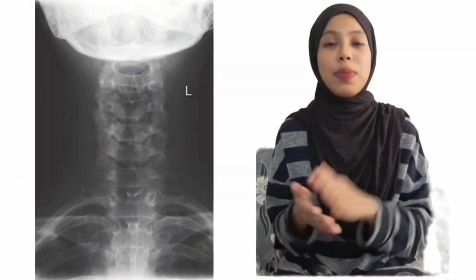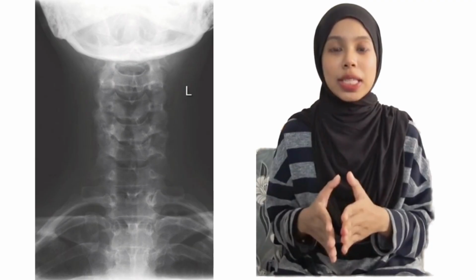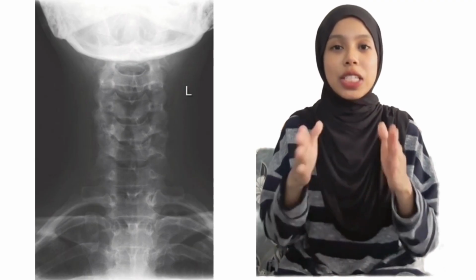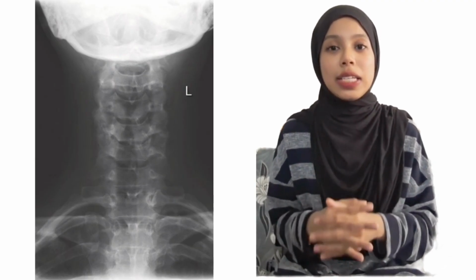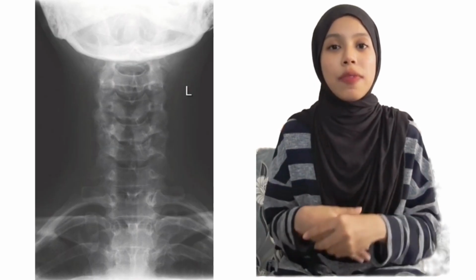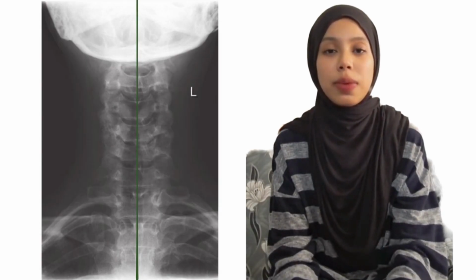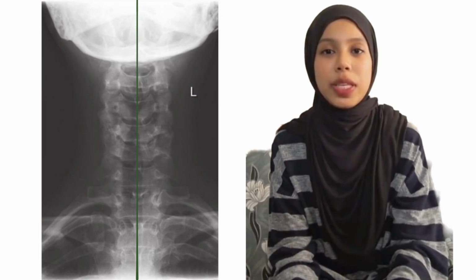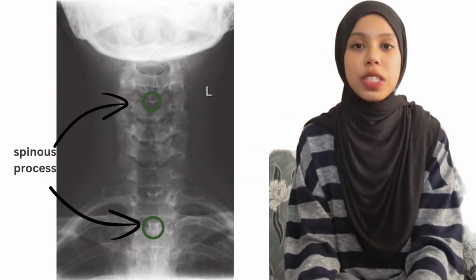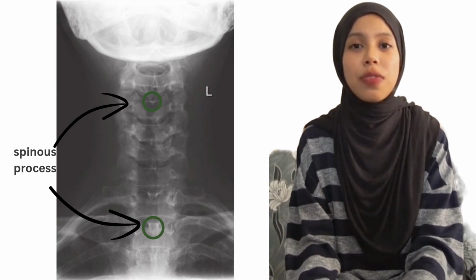This is an ideal projection of the cervical vertebra. I say so because the cervical vertebrae are seen in profile, and the spinous process is centered and in the midline of the vertebral body. The spinous processes align with the midline in a straight line and are equally spaced. The spinous process of the vertebra is demonstrated onto the inferior adjoining vertebral body.